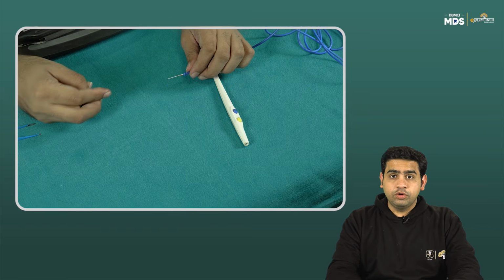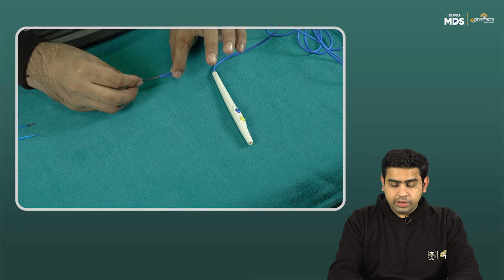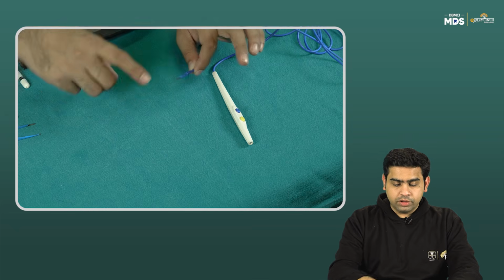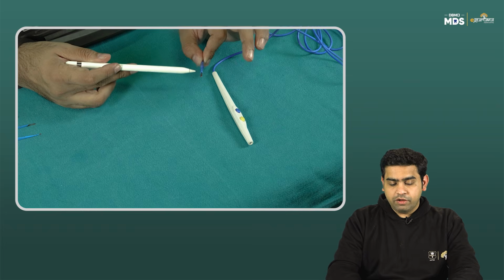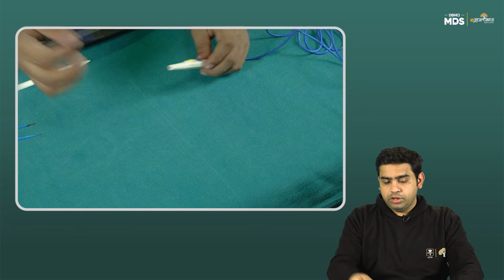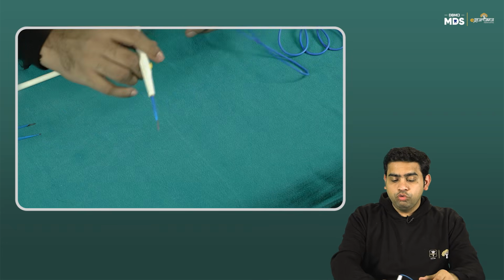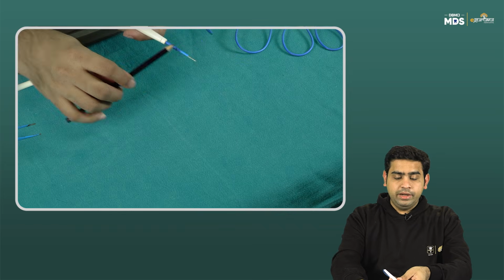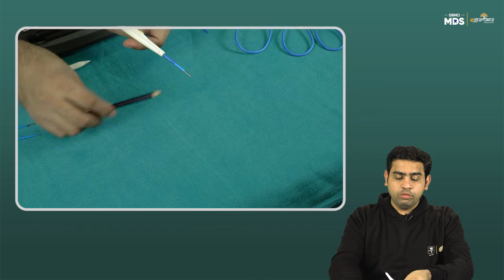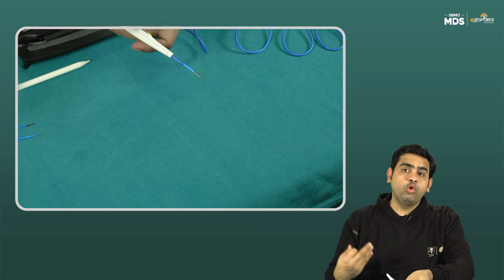That was the insulator. What you need to understand is that we can cut that particular insulator. So earlier I showed you that it was covering the entire tip of that particular cautery. So now I have cut that insulator, because let's assume this tip basically attaches over here, that's fine. And when I want to use the cautery in the depth, this part should not get touched with any other tissue because it can pass the current to the places where I do not want it to go.